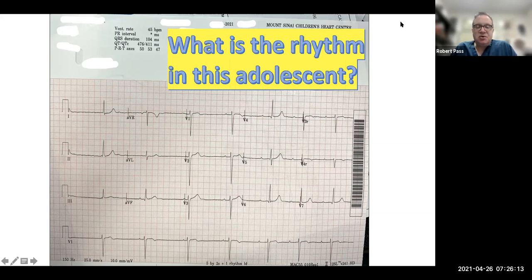Sometimes I'll use it in describing a Holter. I usually refer to it only when you see it late at night when somebody is sleeping. That's a normal finding. But this is, I think we would agree, the P wave is basically the same in all. When you see a P wave, it all looks about the same. So I don't think this is a wandering atrial pacemaker. Also, this is not in the middle of the night. I blocked out the time for privacy purposes, but this was done in the late morning. So the patient was awake, was in clinic, obviously, so was not asleep. Okay.